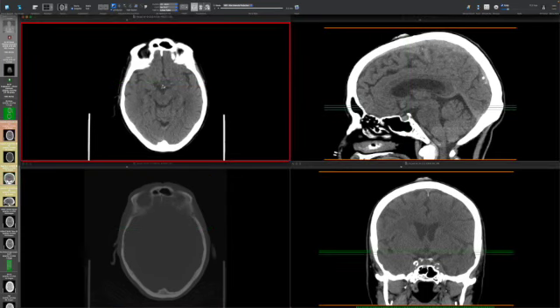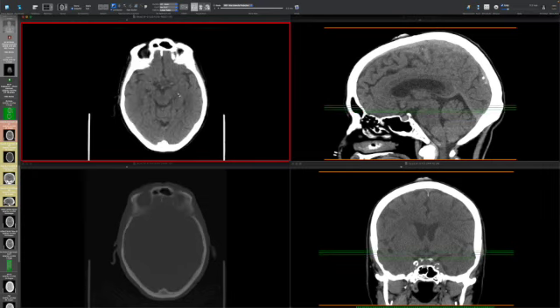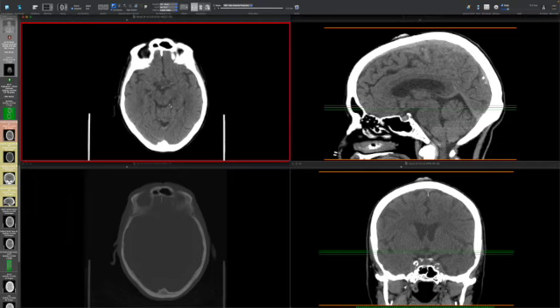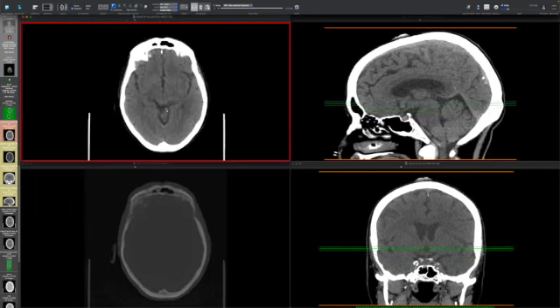And that basically should be filled with vascular structures, the optic chiasm, the pituitary stalk, and CSF. When there's mass effect in the brain, these cisterns can get tight because the brain is trying to squeeze itself out of them. So this is the suprasellar cistern, this is the quadrigeminal plate cistern, and the perimesencephalic cisterns, right? The cisterns around the midbrain, and those are all patent and look great.